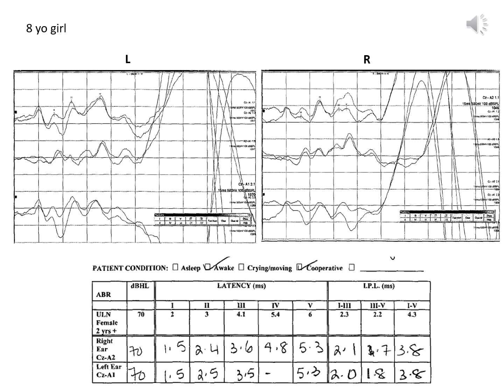Moving to the right, the interpeak latencies, we will notice that the difference between the 1 and the 3, the difference between the 3 and the 5, and the 1 and the 5 have all been written down for us. And these numbers are all below the typed numbers, all lower than the typed values. And so therefore, the interpeak latencies are also normal.